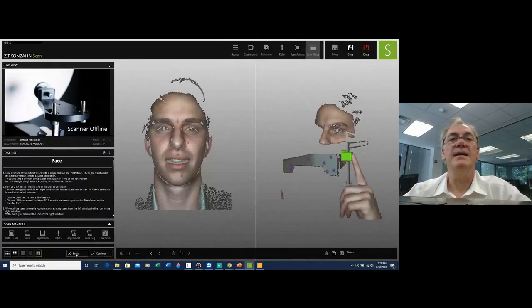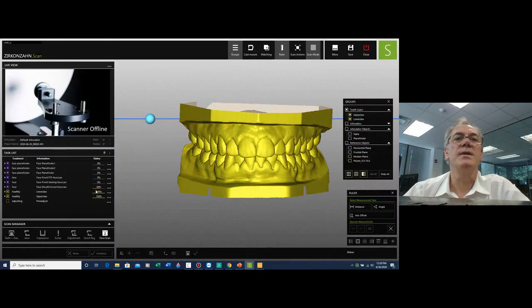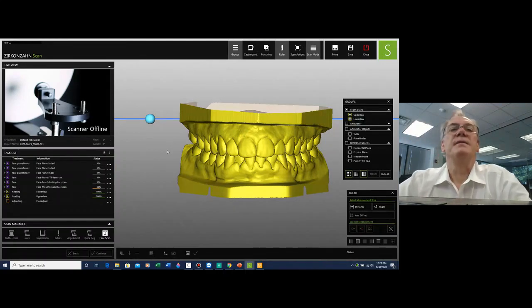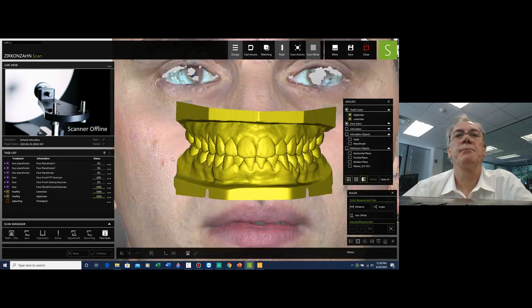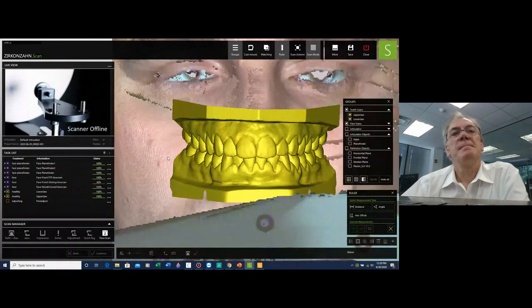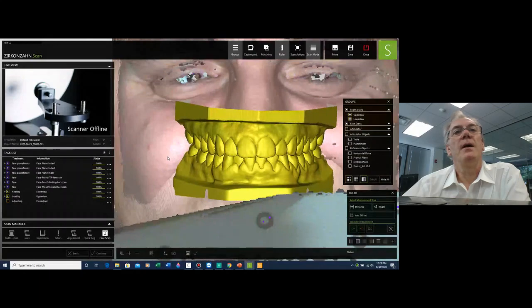At this point, I'm happy with what I have. I have everything that I need. We can go ahead and break the sequence, and you can see it on the left-hand side that the computer is generating all these images, and it will calculate them all, and they will all appear directly into our workflow. It just gives us a couple of minutes. Here they come. And there they are. They're loaded.